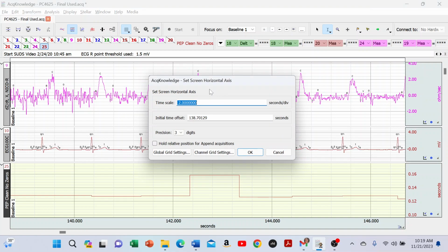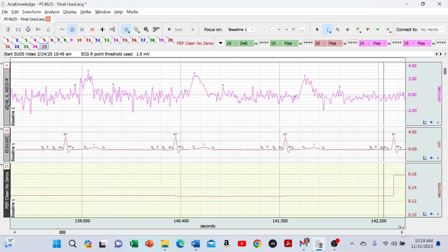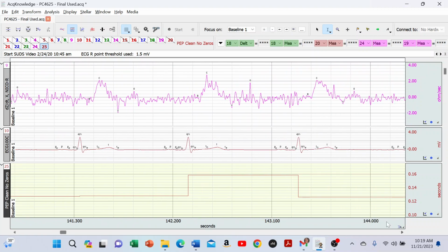It's a time scale of about 0.9, which is zooming in even more than this, if you can believe it. With 0.9, I've already addressed the B points. They're a little iffy, but these are the B points that I still thought were reasonable. So I kept all the data that had reasonable B points.